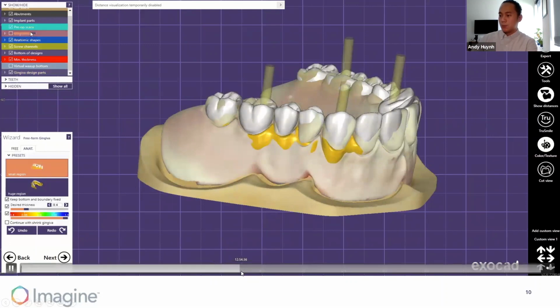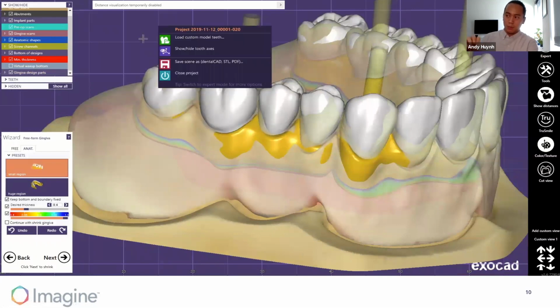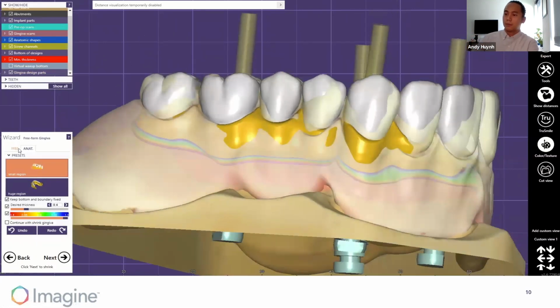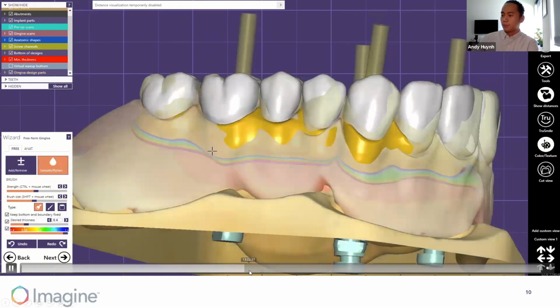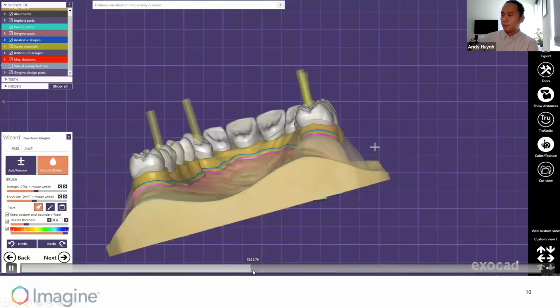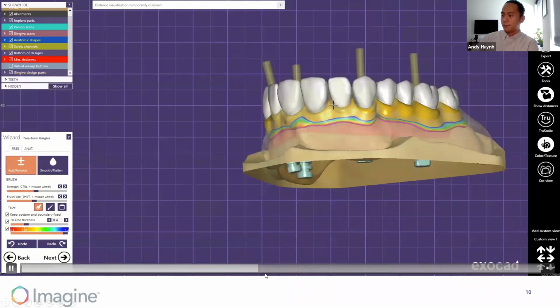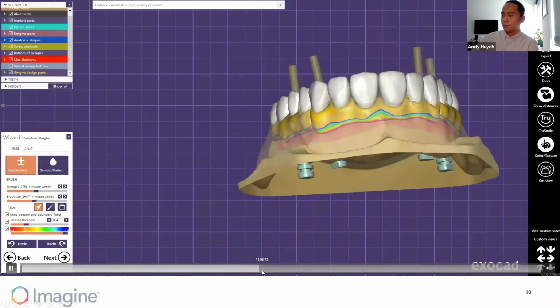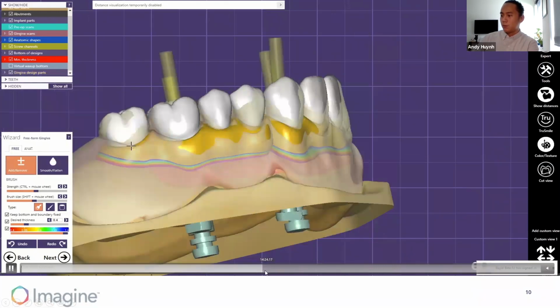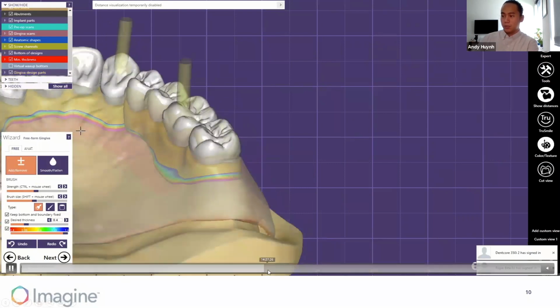In this step, we have the option to freeform. You see the small regions versus huge regions. Here I like to focus and actually fill in our black triangles so we can take our small region and just pull it up in between the teeth. Right, so we're just free forming. I'm just skipping along. And in the next step, we're going to get into the thimble design.